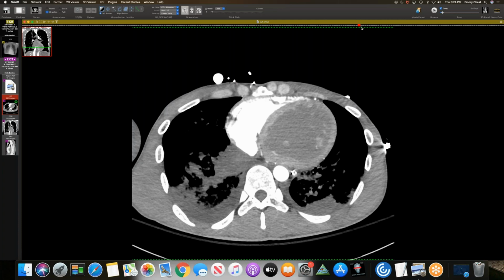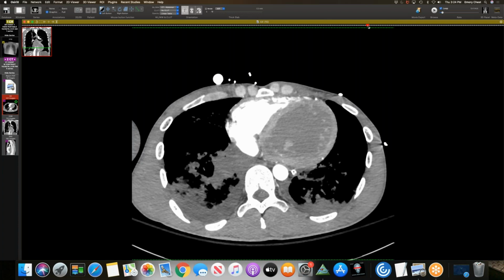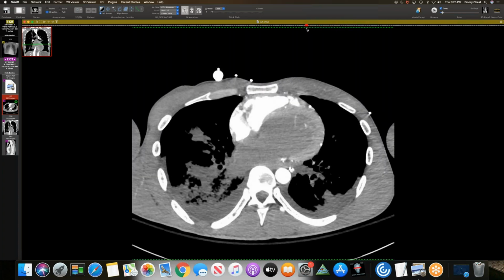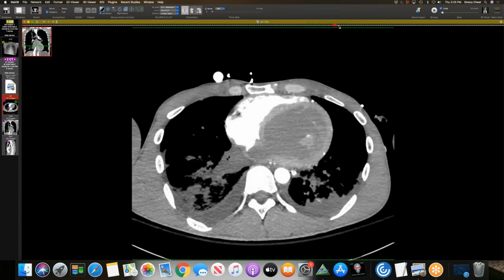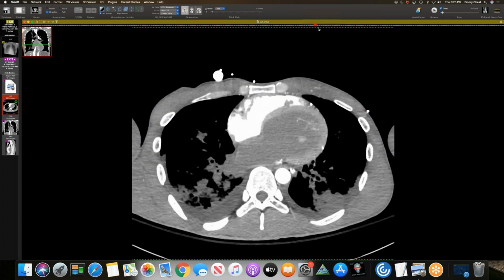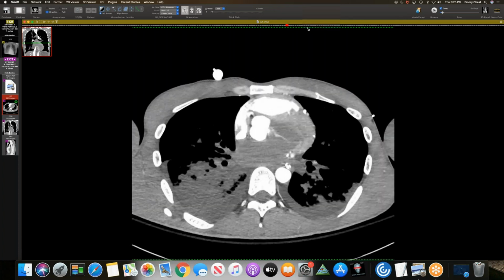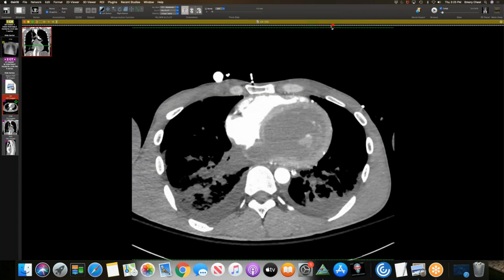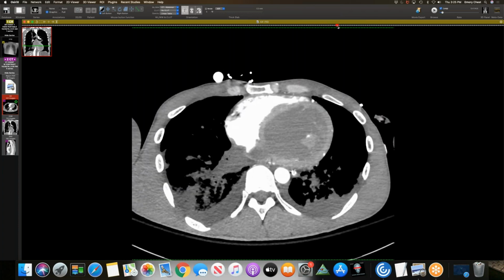Yeah. So is it the VA ECMO patients like this that tend to get the more whited out lungs than veno-venous ECMO, just because of the dependent edema as you're talking about here? You guys know? Based on the article, that's what it seemed like, is that the pressures, the afterload increases significantly with the VA ECMO. And I'm not sure with the veno-venous. I mean, obviously the lungs are again bypassed, but I don't know if the left ventricle has to push to get such a high afterload with those.